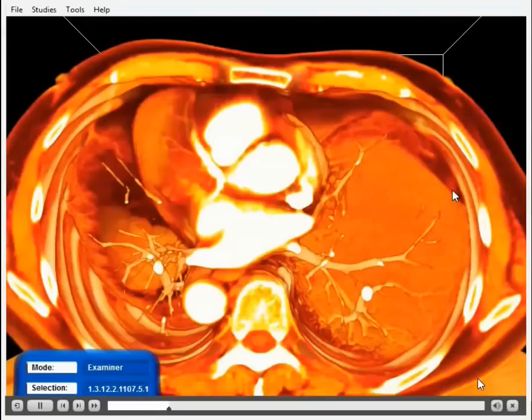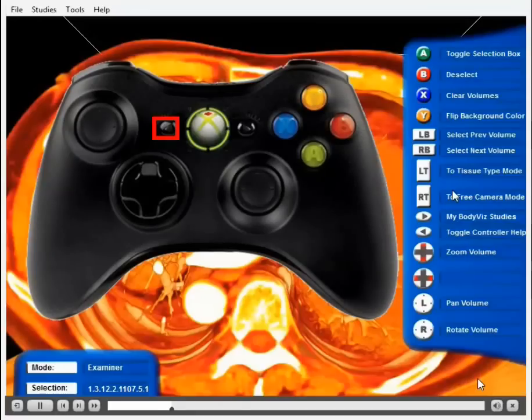screen. What I'd like to do is actually demonstrate how the control mechanisms work. So bring up the control box, which is the left arrow near the green key on your Xbox 360 controller, but this should be visible on yours automatically, and actually see how these controls work. You'll see that this is going to be all the controls on the Xbox 360 and what they're going to do in this particular mode. I'll show you how to change modes here in a moment.